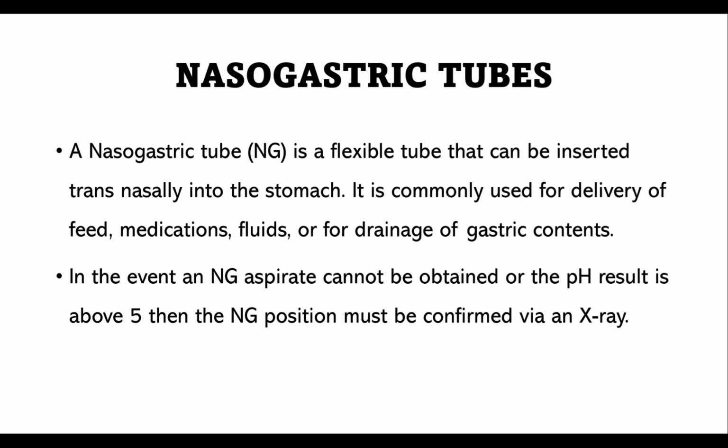It is commonly used for delivery of feed, medications, fluids, or for drainage of gastric contents. In the event an NG aspirate cannot be obtained or the pH result is above 5, then the NG position must be confirmed via an X-ray.